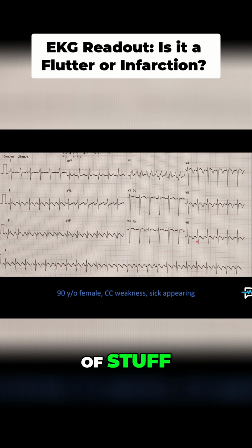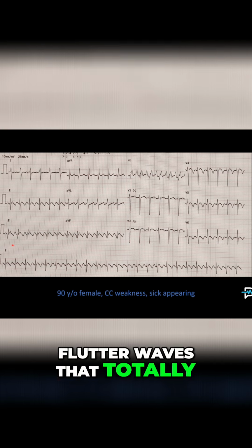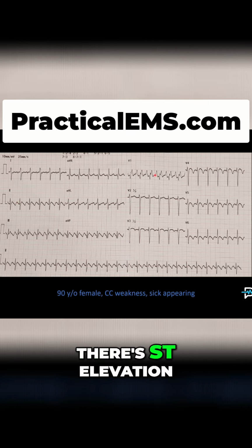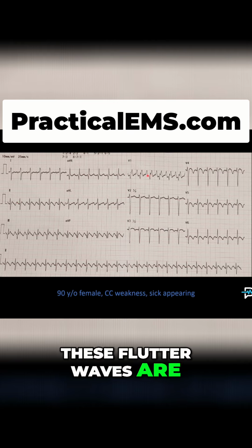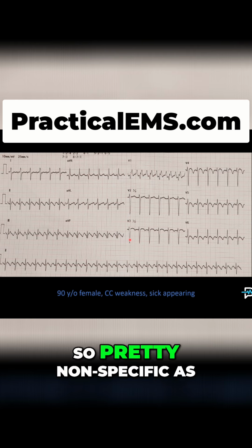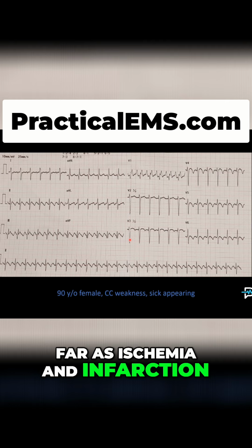obscure a lot of stuff. Maybe some T-wave inversion here, but a lot of these are just the flutter waves that totally obscure any T-wave morphology. V1 actually looks like there's ST elevation, but that's just because these flutter waves are coming so early you can't see the J point in the ST segment. So pretty non-specific as far as ischemia and infarction.